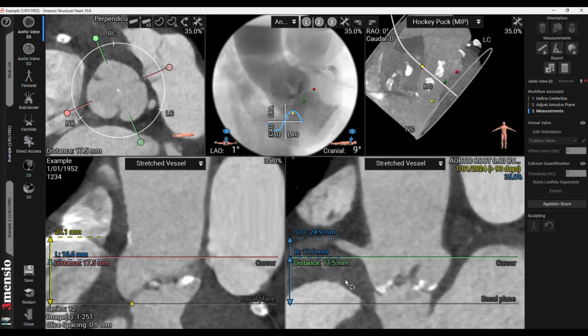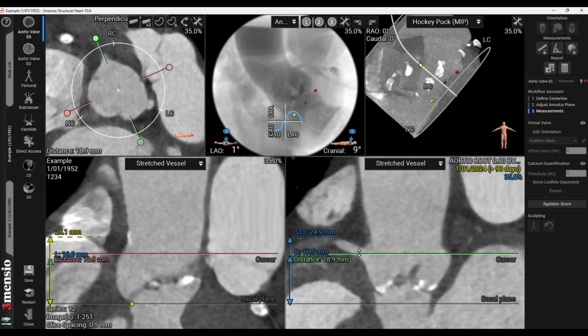At this point, we can also look at our leaflet heights. This is coming to the mid of the coronary, and we can see that there's not really that much there. The commissural alignment for our leaflet is here, but it's not that thick a leaflet. So we know that our leaflet is not actually going to be obstructing in this coronary.